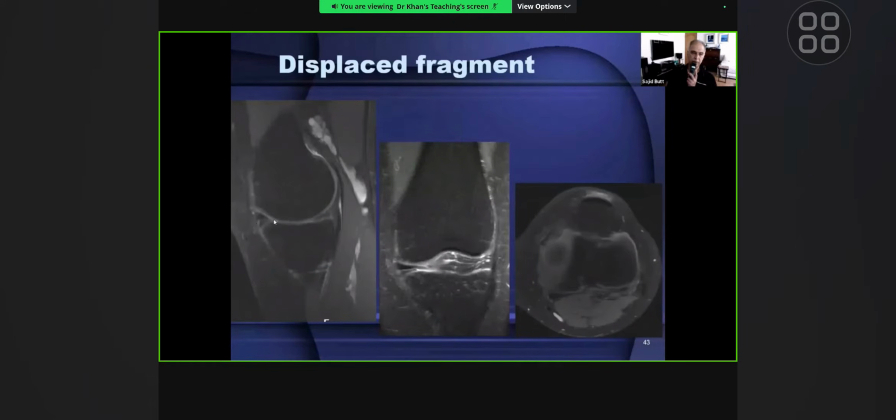And when you look carefully, you realize that there's actually not an anterior horn by itself, but some of the meniscal tissue from here has flipped forwards and has resulted in this sort of double meniscal tissue present anteriorly, which you can see in the axial imaging here and in the coronal imaging there. So there's an abnormal meniscal tissue which is transferred from back to the front.